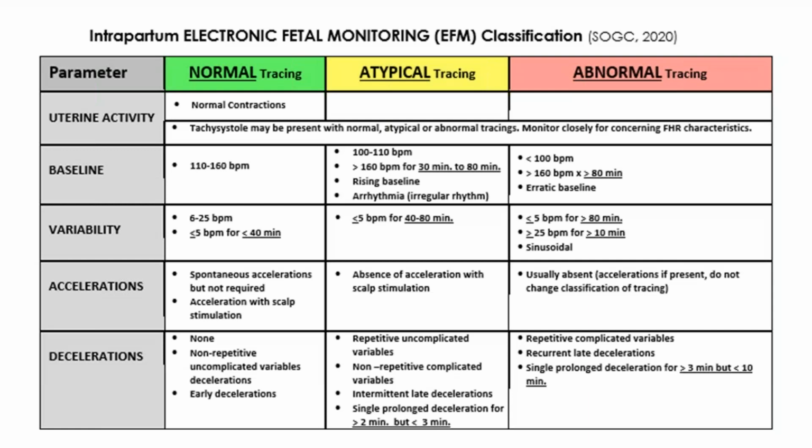And certainly, if you've got a substantial bradycardia or tachycardia, or an erratic baseline, that's always important to know when you've got a good quality pickup and you can't determine the baseline and it's all over the place. That may be associated with acidosis, with instability of the cardiovascular system. So erratic baseline is a concern, just like marked variability is in a situation where the fetus is otherwise not showing you well-being. If you have marked variability, that is abnormal after 10 minutes.